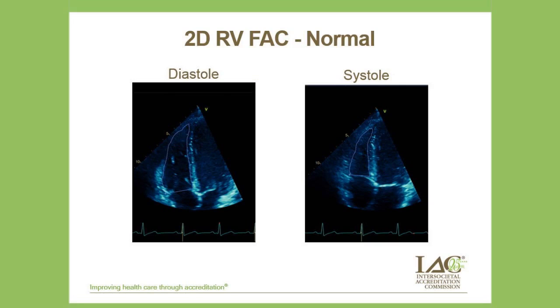And even if you are really wanting to get this and can't see the right ventricle well, or left ventricle, and you're giving the patient contrast, you may even try, as the contrast fades out of the right side of the heart, to freeze a diastolic and a systolic frame and then trace them out later. That could be beneficial in making this measurement because sometimes it's very difficult to see the walls and where to actually measure these. So just make sure that you do it on the same complex. You do your diastolic and then your systolic.